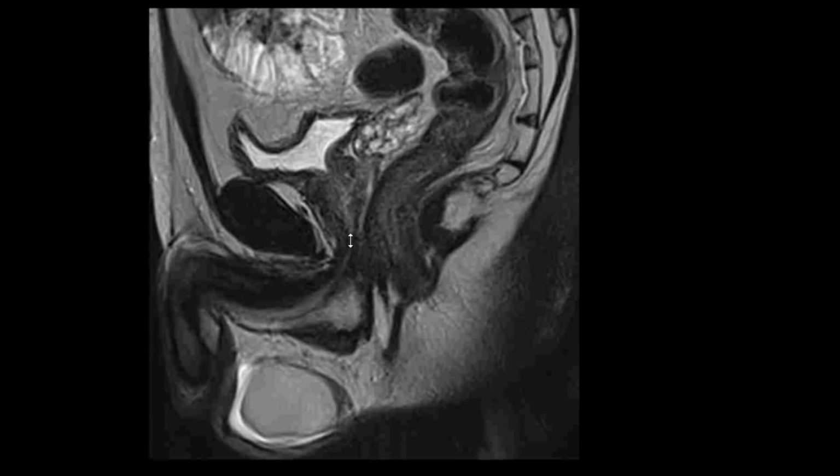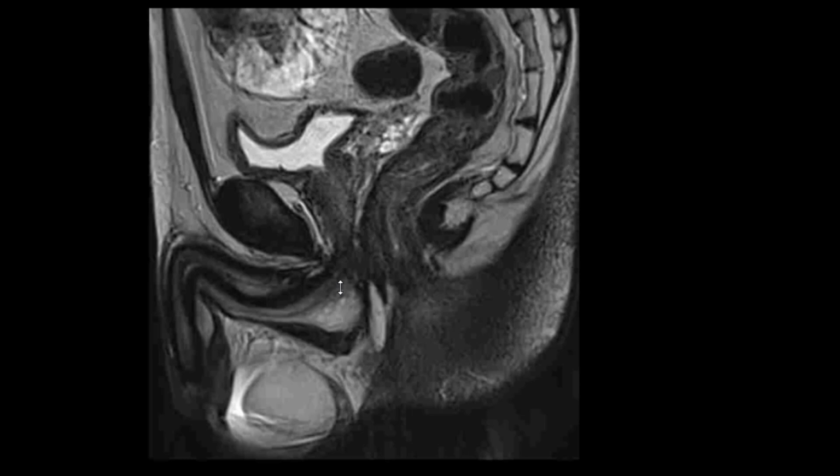From the prostatic segment, we have a short, narrow segment where the urethra has exited the prostate gland and now travels in the deep pelvis and exits through the urogenital diaphragm, and this is known as the membranous urethra. Beyond that, it is now the bulbar urethra inside kind of the base of the penis. And then as it exits anteriorly, it becomes the penile portion of the urethra, as it is outside of the abdominal cavity.